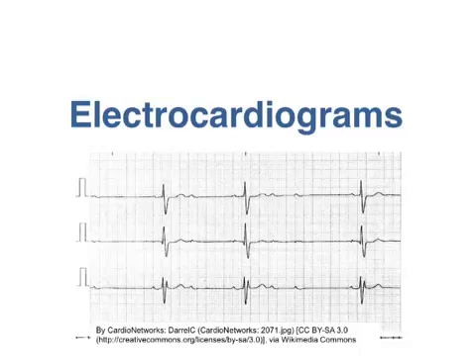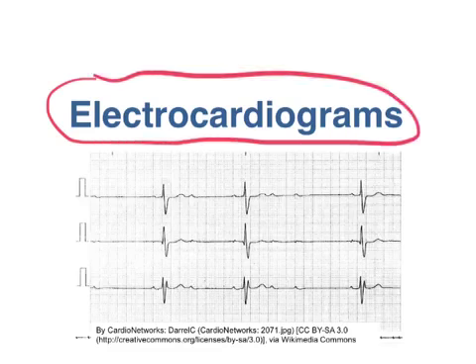In this video, we'll be talking about EKGs, also known as ECGs, electrocardiograms. You're looking at a sample EKG down here. The EKG is a composite tracing of all electrical activity of the heart. It's not an action potential. It's very important to remember, not an action potential.